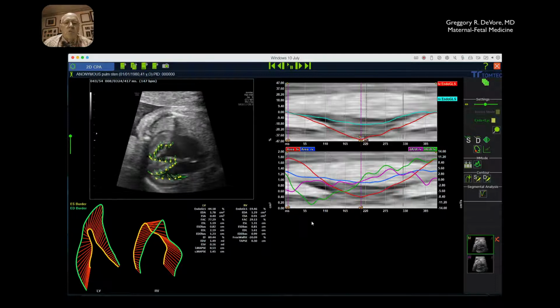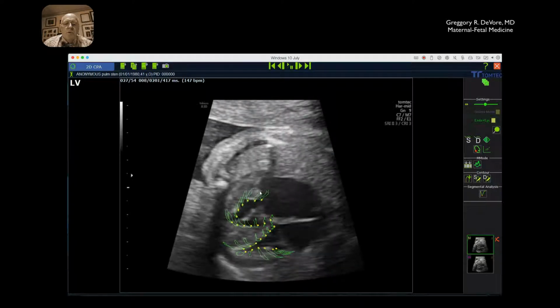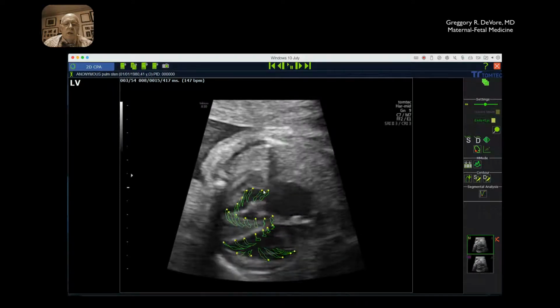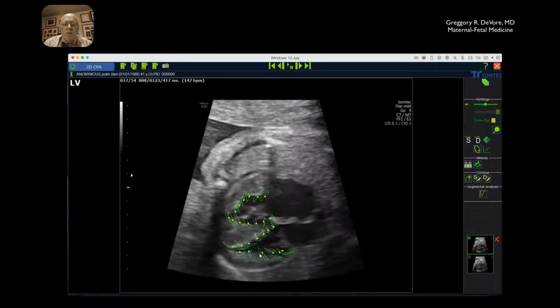What I'd like to do is discuss what we see on the screen. Let's first look at the overall clip. This is the left atrium, left ventricle, right ventricle. As you observe the movement of the walls, what is striking about the movement of the right lateral wall and the interventricular septum of the right ventricle? You'll notice that there is a lot of movement of the septum towards the left side of the heart. This is atypical and abnormal. So again, look at the motion of the yellow dots. Also, there's an exaggeration of movement of the left ventricular septum and lateral wall.